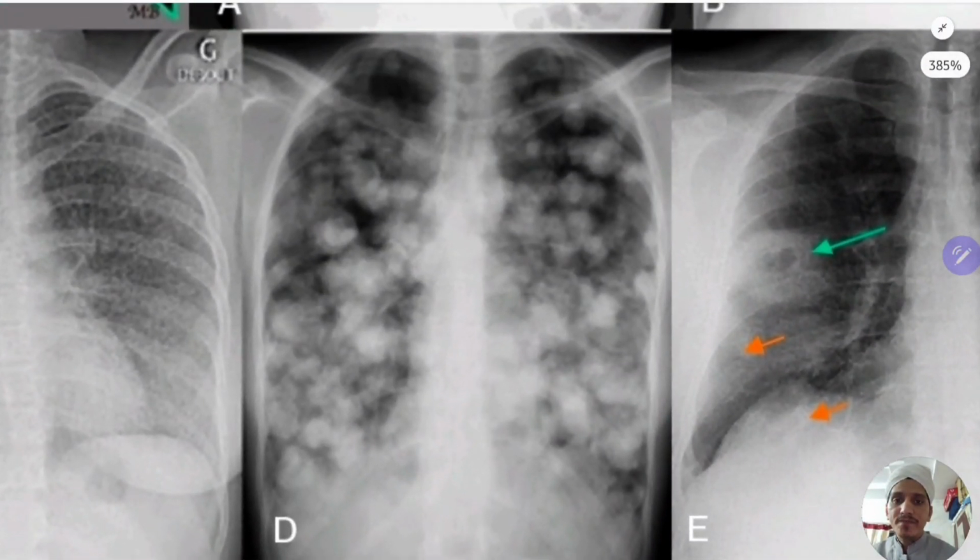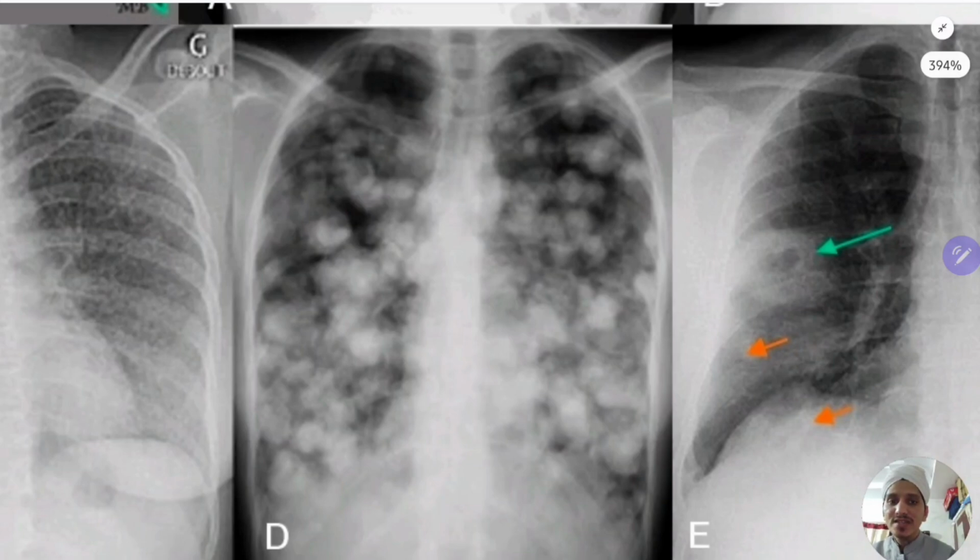Now you see this X-ray. How is this X-ray? You can see whitish opacities of varying size, cotton ball-like opacity, cannon ball-like opacity. These X-rays are very typical. After seeing them, if you see a similar X-ray in some other patient, you will immediately say what the diagnosis is. Very typical, very high-yield X-rays these are.